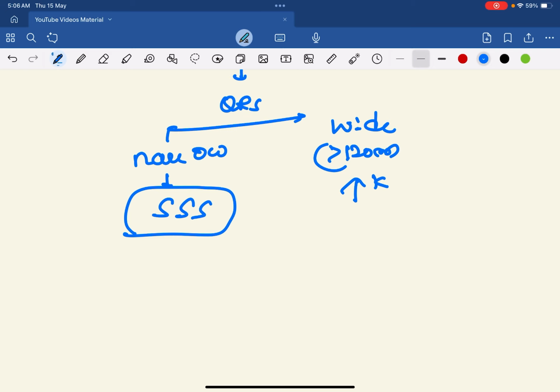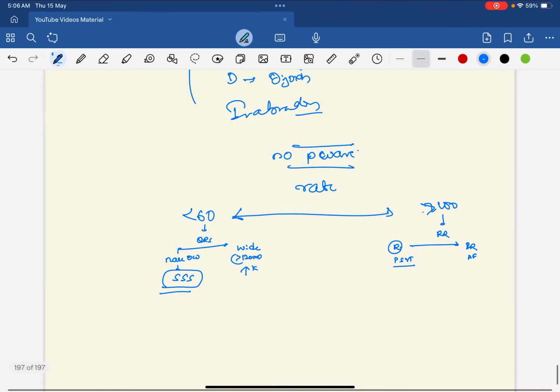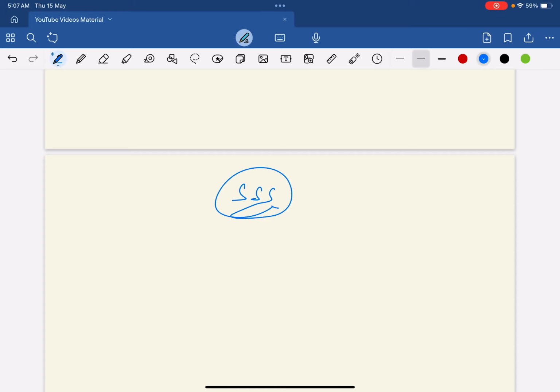In this case it is 43, so junctional rhythm could be possible, but in junctional rhythm you may get an inverted P wave. Here absent P wave is there, so it may be sick sinus syndrome. So far our interpretation and diagnosis point to sick sinus syndrome or sinus node dysfunction.